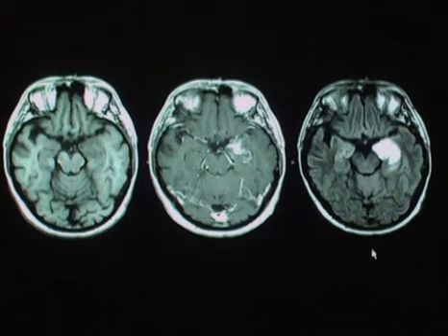One thing you might ask is, how do we tell this from a temporal lobe glioma or some malignancy of this sort? And actually, that's what it was thought that this patient had. They had been referred to our neurosurgical service. They underwent WADA testing because this patient had repeated seizures. Upon pathologic review, following a partial temporal lobectomy, this was found to be herpes.